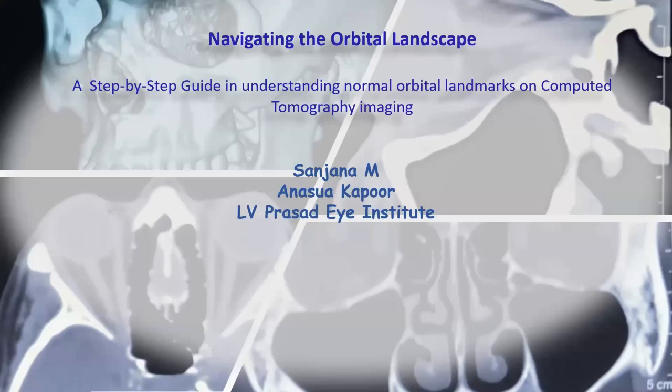Navigating the Orbital Landscape, a step-by-step guide in understanding normal orbital landmarks on computed tomography imaging.